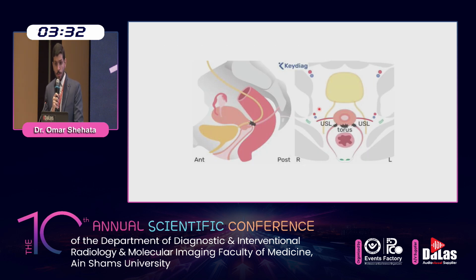The second compartment is the mediocentral compartment, which is the most frequently involved by endometriotic deposits. The compartment is further subdivided into three smaller compartments. The first one is the torus uterinus and the proximal uterosacral ligament. The torus uterinus corresponds to the site of uterosacral ligament fusion to the cervix, forming a semicircular shape like here.